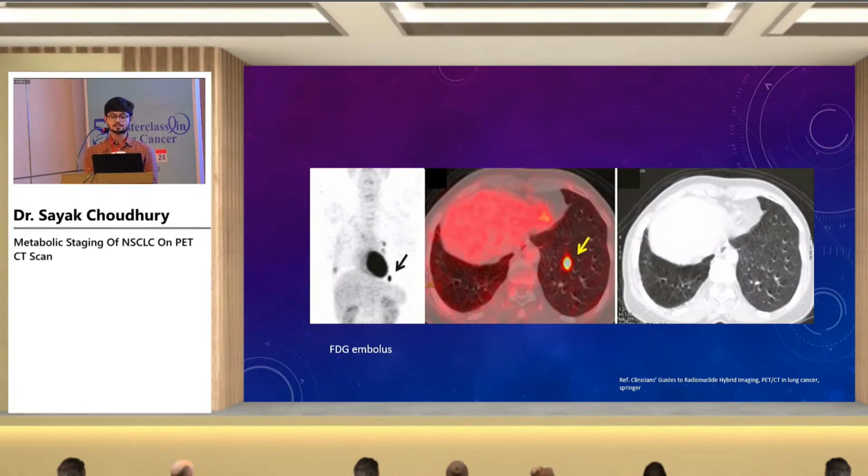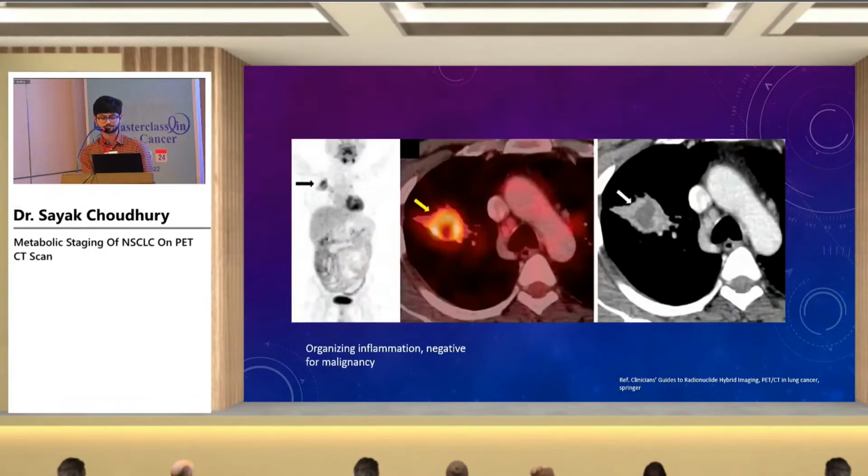You will not see anything in CT, but you will see a focus of increased FDG uptake. If you see such a scan as a fused scan in PACS, you will get confused. But if you look at the CT, and also understand if the patient has been injected from that side, then you can solve it.